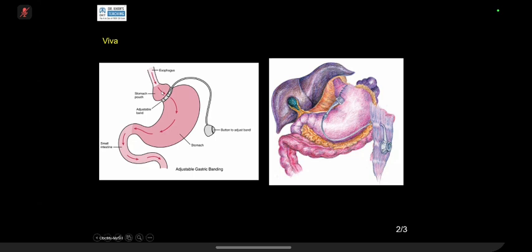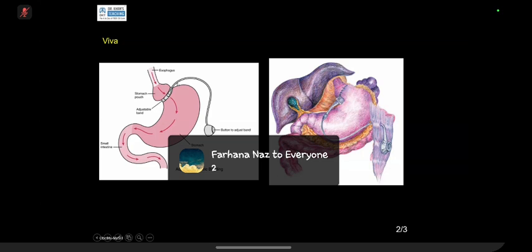The basic idea in gastric band surgery is that this is done for obesity, morbid obesity. The concept is they create a new stomach. This thing is only about 30 ml. And look at this: talk about o'clocks. If I ask you what is the o'clock of this ring, which is this clock, is it 6, 7, 8? What do you think? 7. And what is this? 1 or 2, right? So this is the normal position.